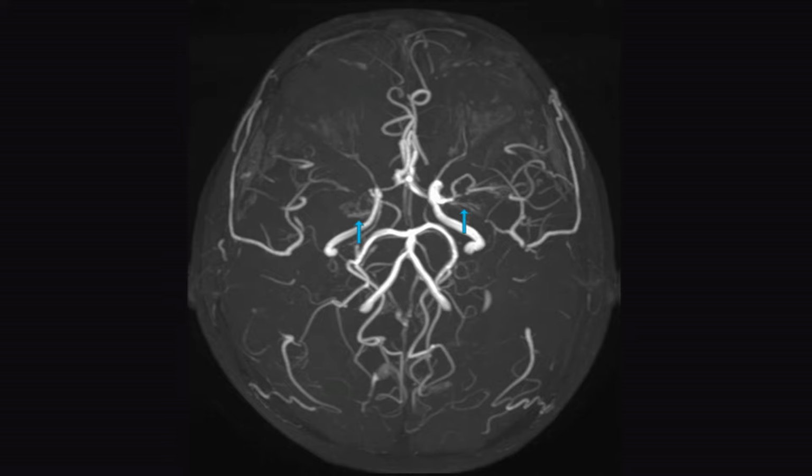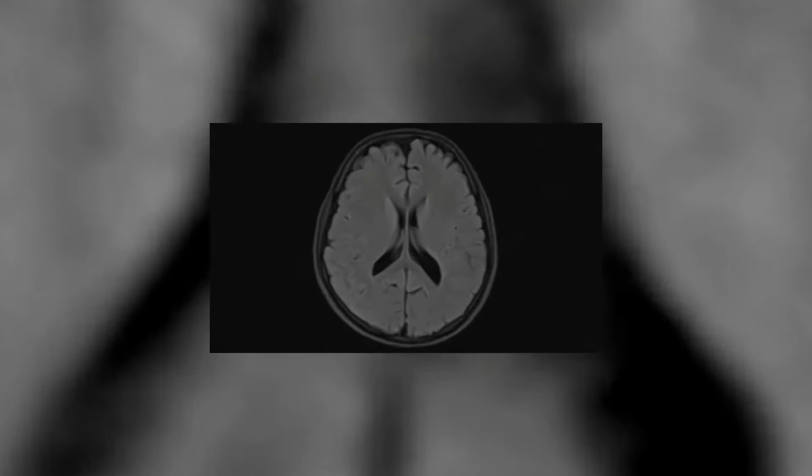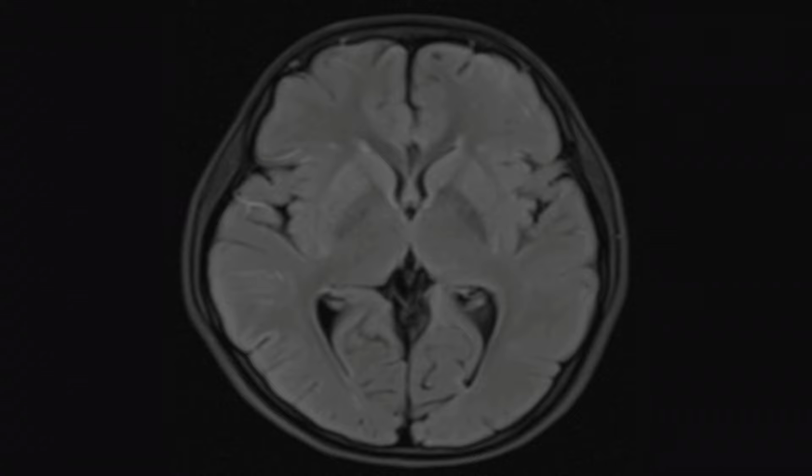It is important to have a high degree of suspicion to diagnose collateral vessels, and if possible perform digital subtraction angiography and a contrast study of MRI to diagnose a case of Moya Moya disease. Vessel wall imaging has a definite role, where you can see the intimomedial thickening and definitely differentiate the thickening from the atherosclerotic disease pattern.